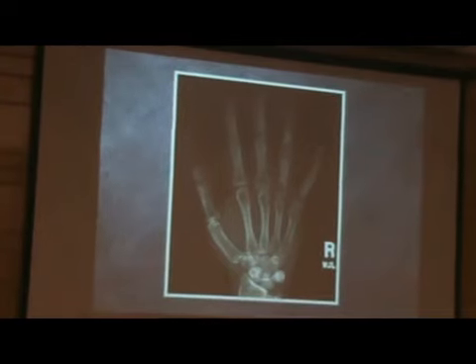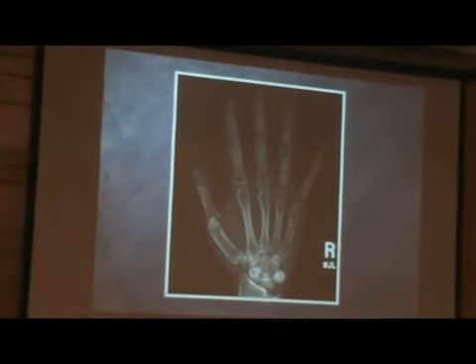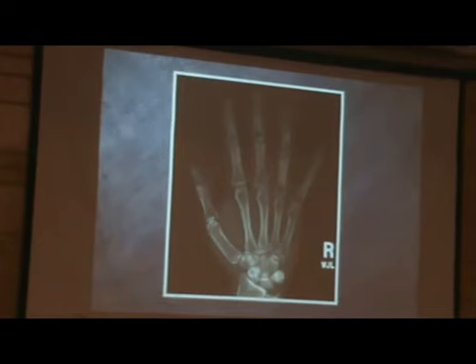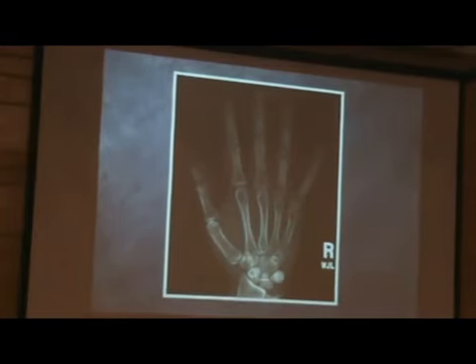Here's an example of a patient coming in with hand pain. As you can see, there are several lesions. There's one here, and more distally destroying the cortex, right around here. Elsewhere in the body, you can see it in the skull and long bones, when you see this type of permeative lesions with cortical destructions, we would be thinking about metastatic disease or myeloma.